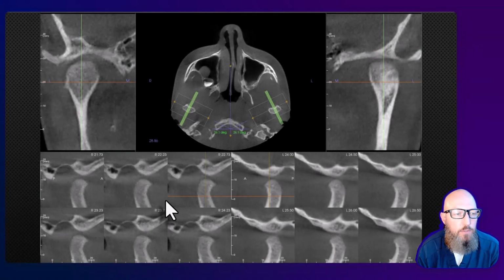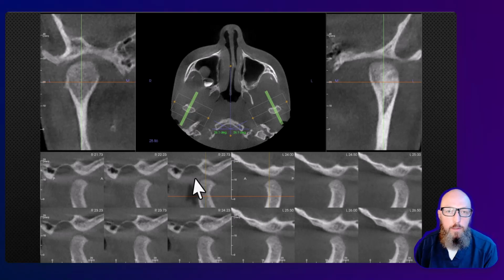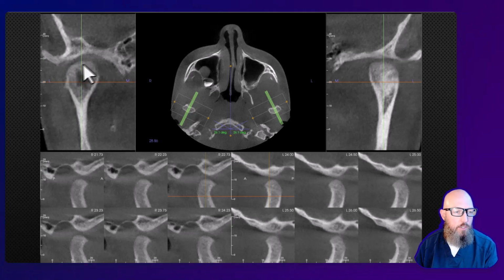And so if I told you this was a 12-year-old patient, it should probably change the way you're thinking, because the mandibular condyle is a growth center for the mandible. And so this continues to grow until about puberty. So if this patient's only 12 years old, and you'll see even more so on younger patients, you're not going to see that well-established cortex like I showed you in the other normal case. In adults, that's what you're looking for, a nice, well-established cortex.